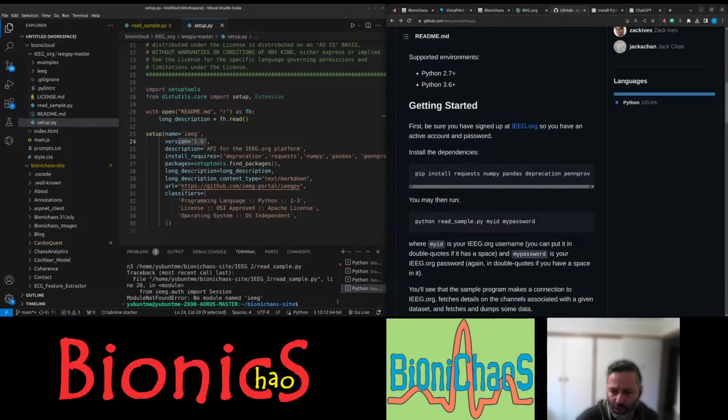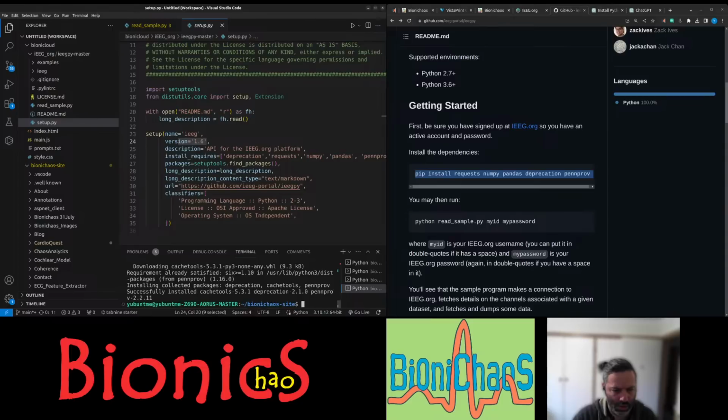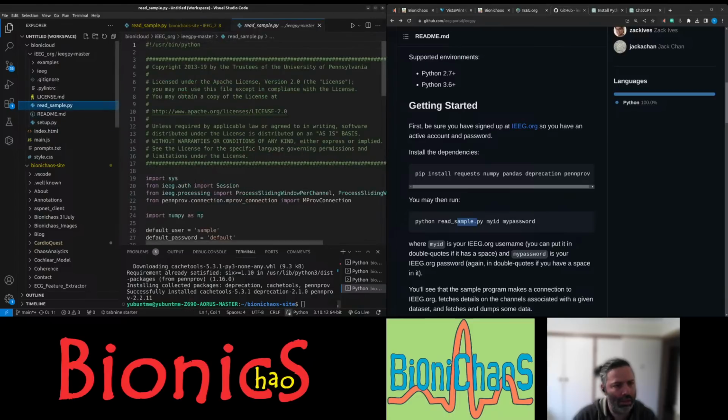So after installing those, we can run the read sample. Right, that's went away.